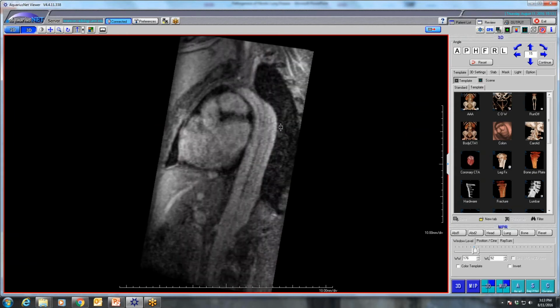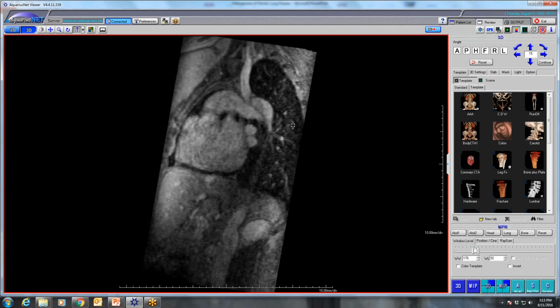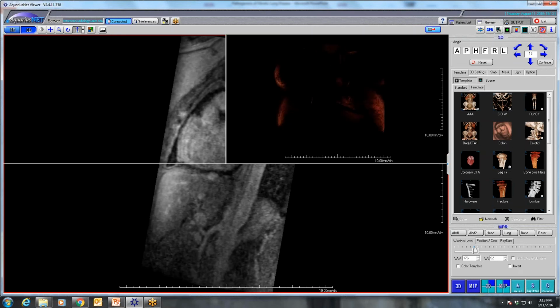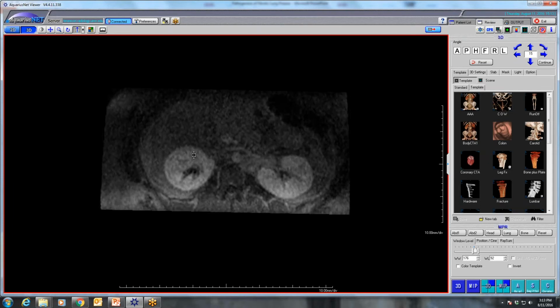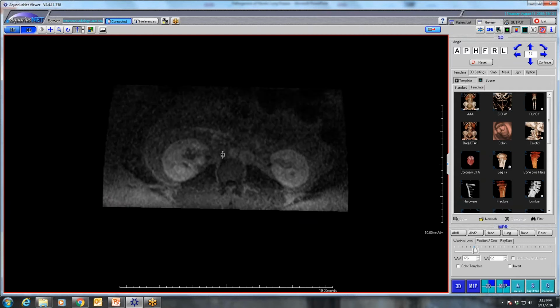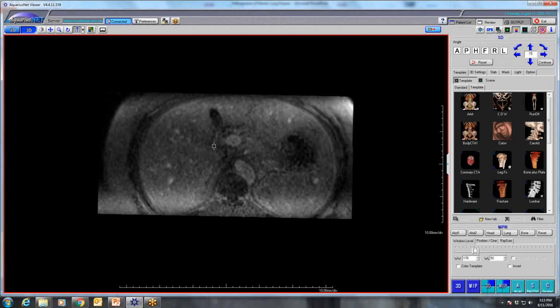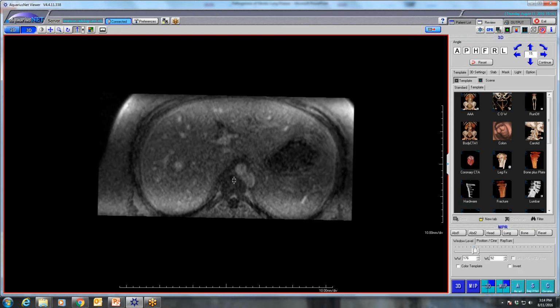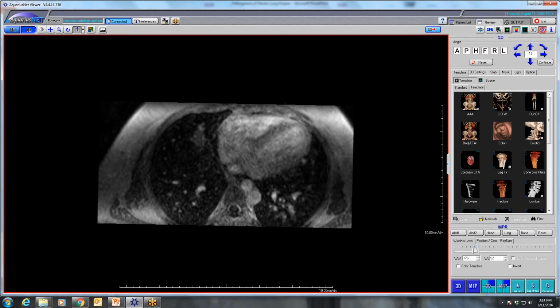You can see here, this is a parasagittal view. We have an aorta, and then we have this other vessel that's mirroring the aorta. And this is a hemiazygous continuation of the IVC. Unfortunately, we didn't go down super low, but there's no right-sided IVC at all. The only venous drainage she has is on her left side. Of course, she has a suprahepatic IVC because she needs that to live.